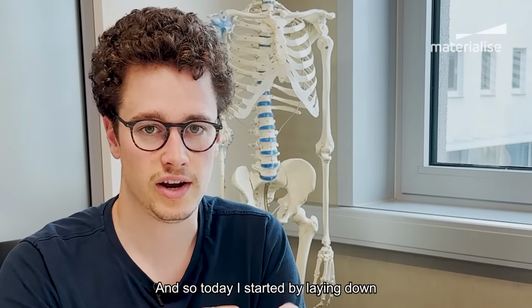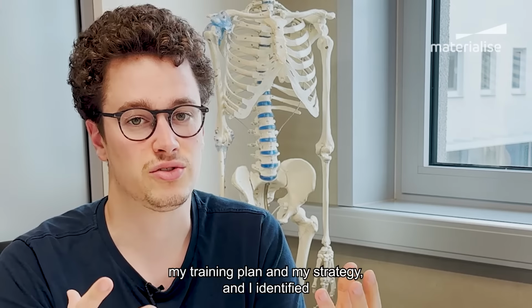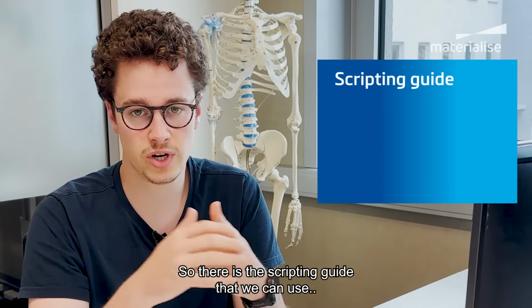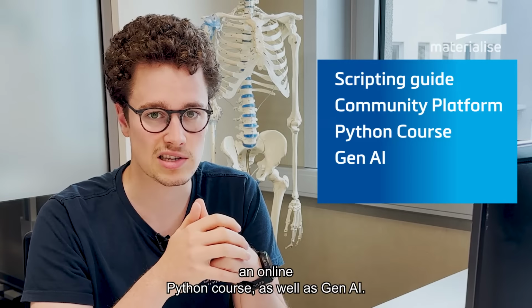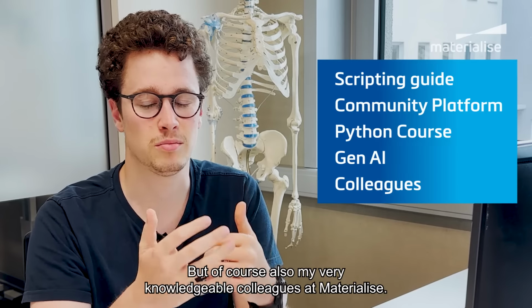And so today I started by laying down my training plan and my strategy, and I identified a few potential learning methods that I wanted to consider. So there is the scripting guide that we can use, there is the community platform, an online Python course, as well as Gen AI, but of course also my very knowledgeable colleagues at Materialise.